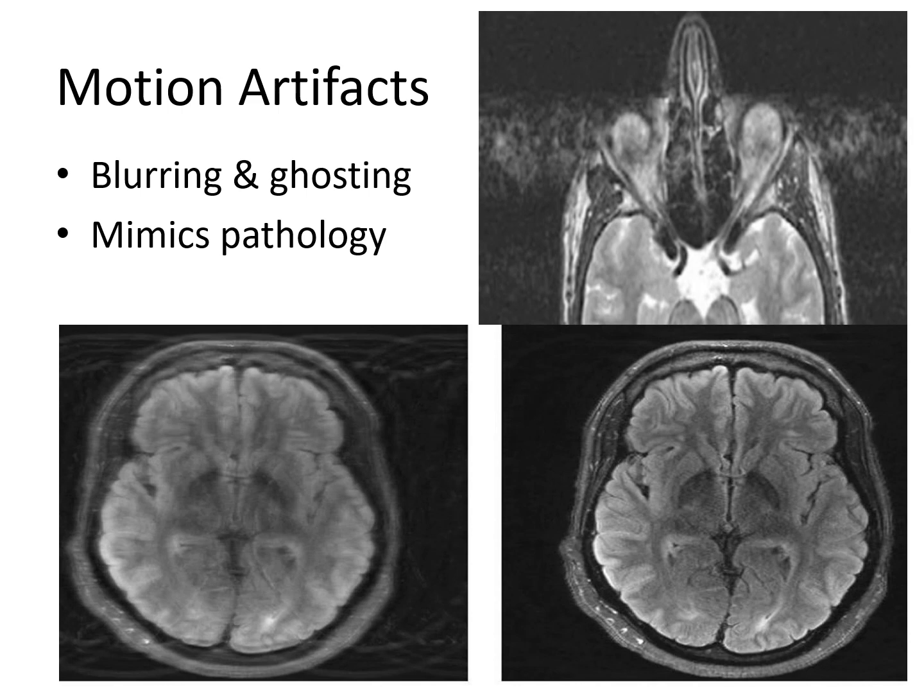Now the motion artifact. What is motion artifact? It is caused by patient movement, respiration or pulsation and it appears as blurring or ghosting, as we can see here in this image. This is the motion artifact. Here we can see blurring of the orbit and paranasal sinus region. In this image also we can see the motion artifact, multiple images overlapping the main anatomical structure. So this is the ghosting.